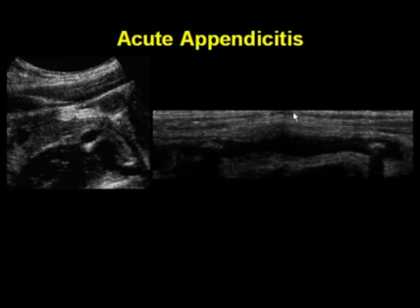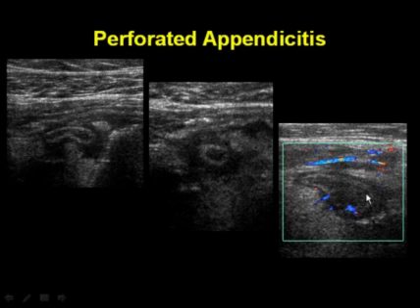Another unequivocal example of acute appendicitis diagnosed sonographically we see here, where we can readily trace out the entire length of the appendix with a stone at the tip, shown in this image with associated distal shadowing.